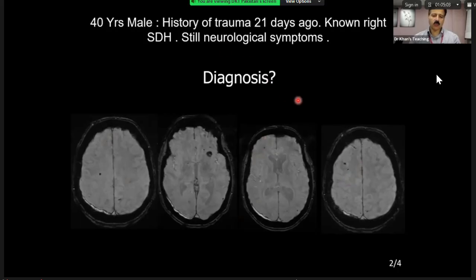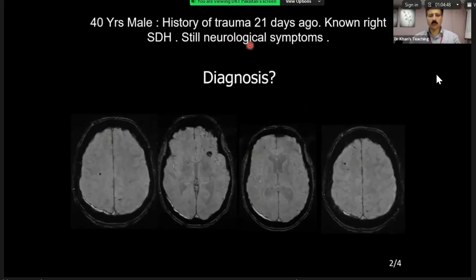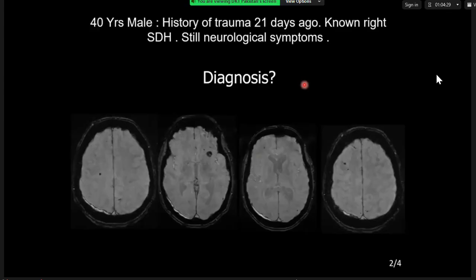With this history, what is your diagnosis? I think in the context of trauma, could these be small traumatic microhemorrhages? So which kind of history the patient had, which can explain the symptoms also, neurology? These hemorrhages or microhemorrhages are at the gray-white matter junction. That is the hint. So a diffuse axonal injury type picture.